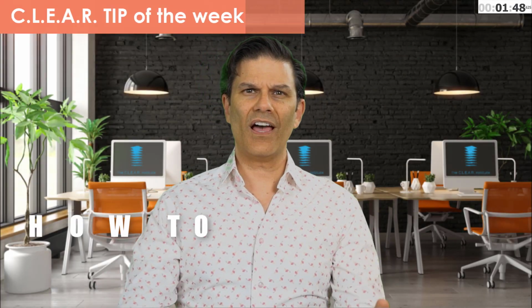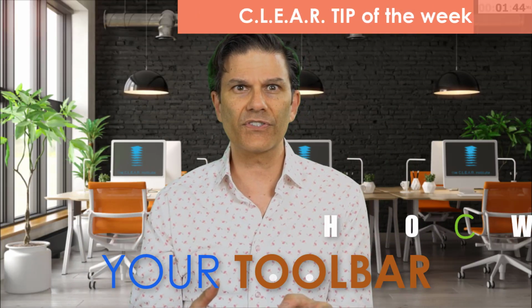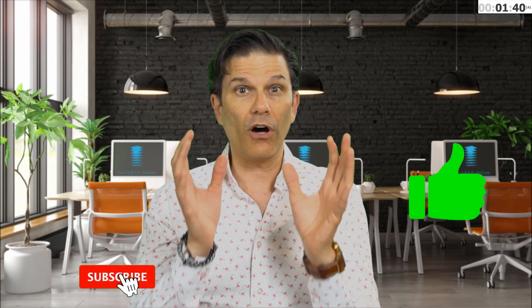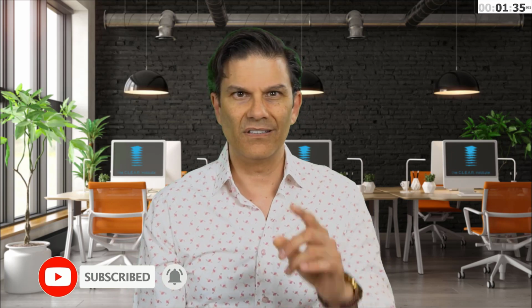Finally found some time to work on your ClinCheck. You sit down, relax, open your ClinCheck, and boom! There are no tools available. You tell yourself, did I pay my bills to Invisalign? Don't worry about that. Your tools are all there. Align didn't take them away, but still, worry about that. Not paying the bills, I mean. I told you 1,000,000 times the check is in the mail.